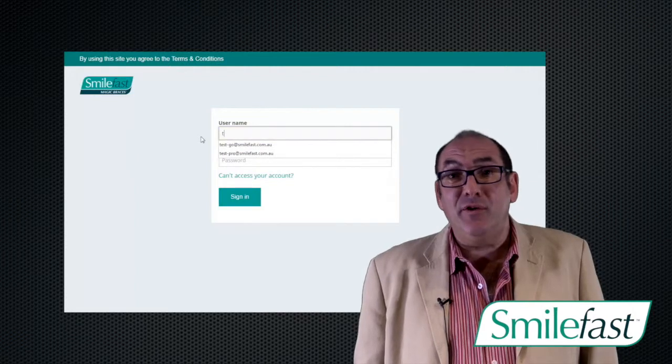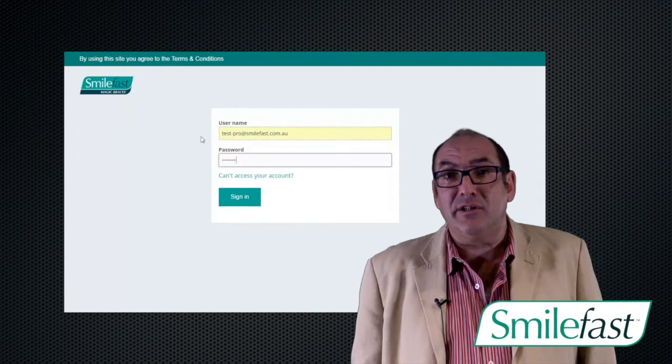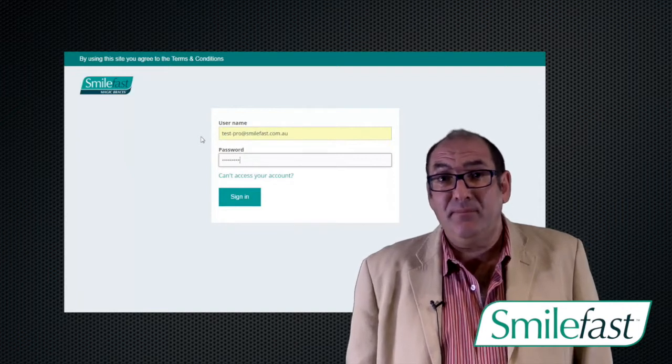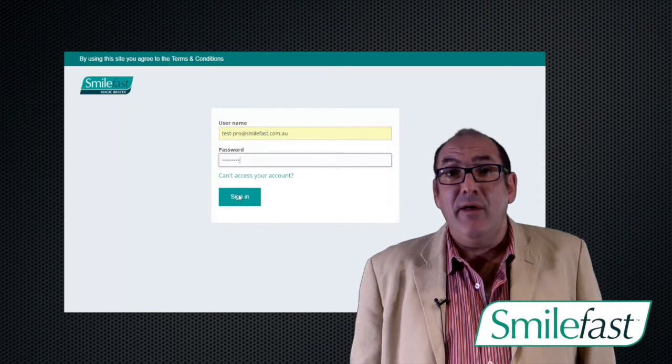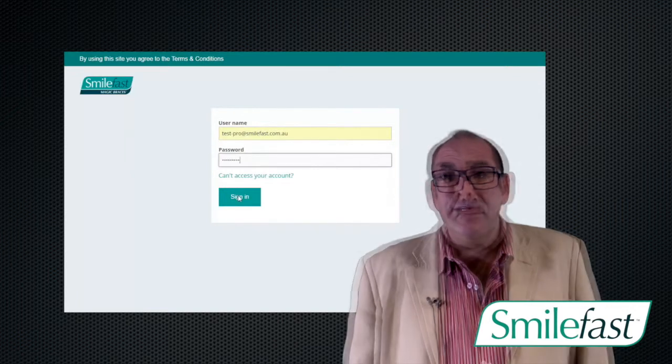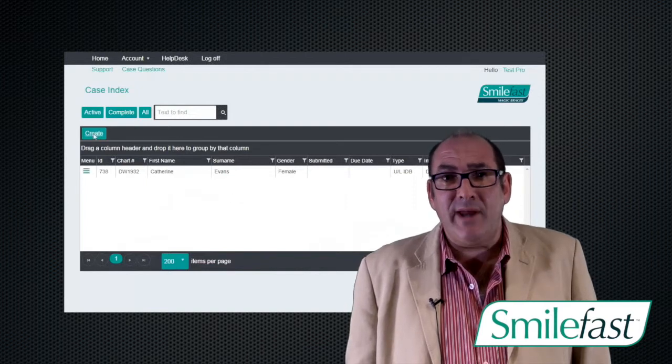Firstly, you log into the Smilefast website, www.smilefast.com.au, and then you will log in with your special username and password that has been given to you previously. So once you've logged in, you want to create a case.